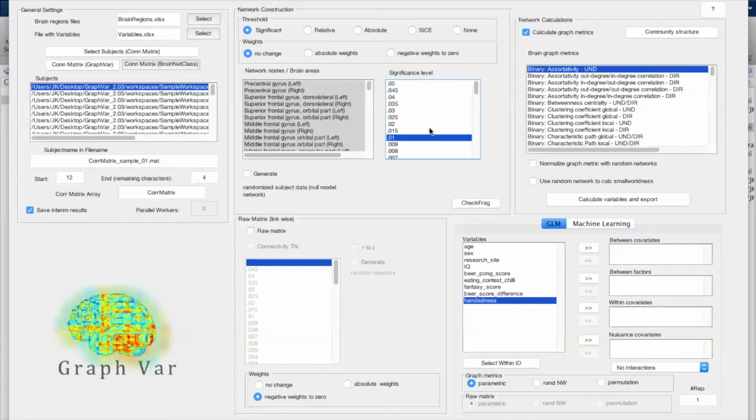And as I just said, if you want to do this, I would urge you to compute the connectivity matrices by using the non-parametric generation of time series for actually getting a valid inference on those p-values. The most common thresholding method to use is the relative thresholding. This is also, as I showed in my previous video, referred to as normalization by wiring cost.